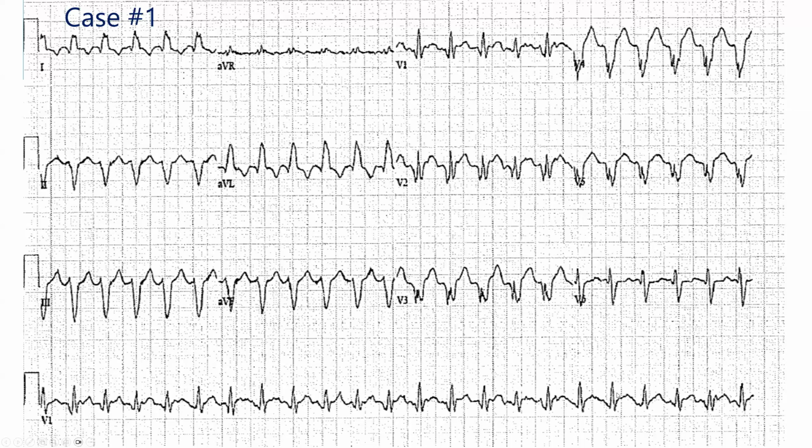You go through these transitions one, two, three times maybe on this strip. And based on the timing and the smooth nature of this, you could even make an argument that what you're looking at is respirophasic differences. But let's jump into what I mean exactly by fusion beats on the next slide.